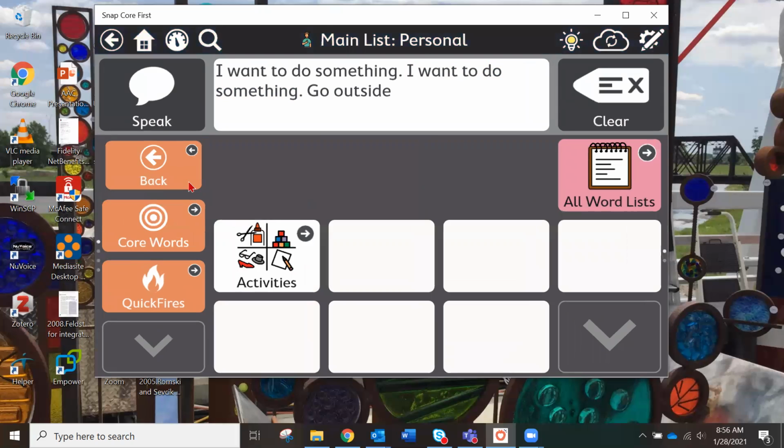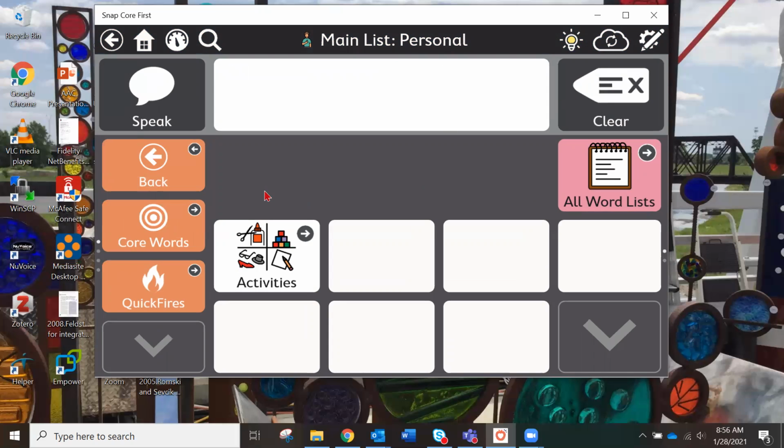After we do our activity and we focus on that, I may not want to keep these keys hidden, because while my client is using the device on their own or in other activities, exploring the device and seeing what happens when you select keys can be a really good part of the learning process.